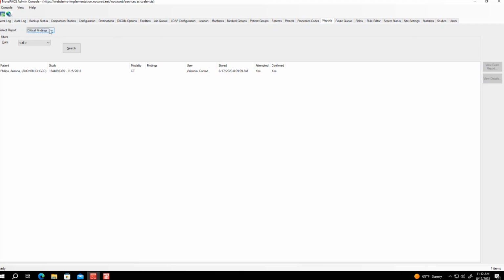So our critical findings report only gives you one filter option, and that filter option is for the date. It defaults to all. Actually, I'm sorry, I believe it defaults to last 24 hours, but you have 24 hours, last 7 days, last 30 days, last 12 months, all, and then you can always put in a custom range and pick whichever date range you're looking for. You do also have to set the time frame as well, so just remember that when you're picking your date range.